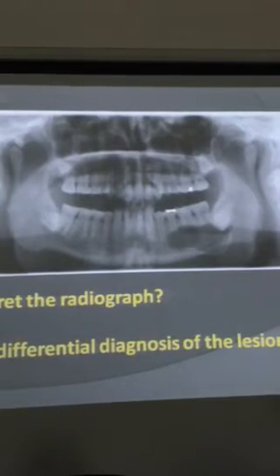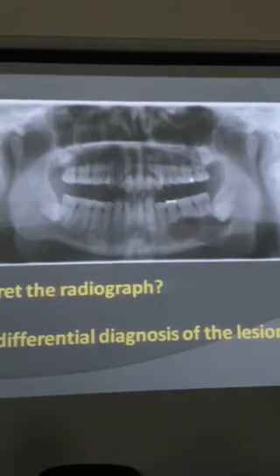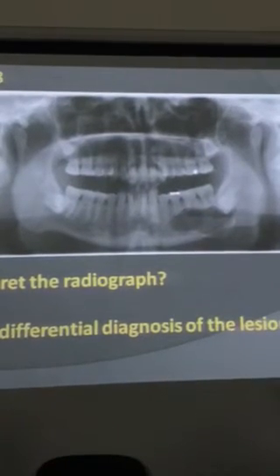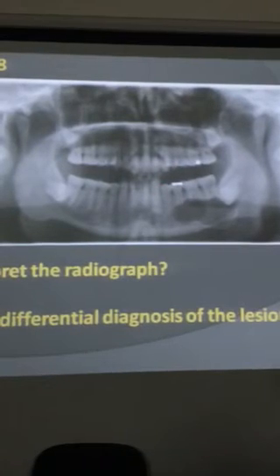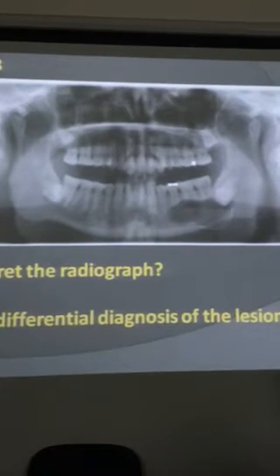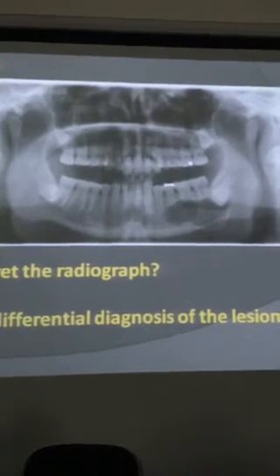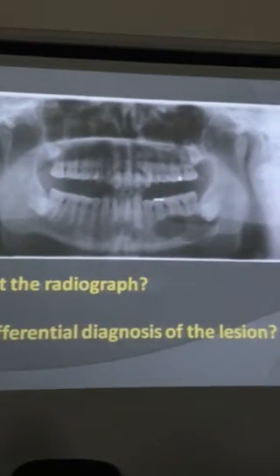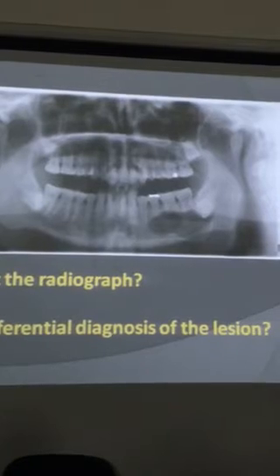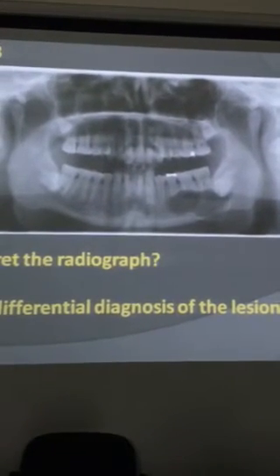Now you can come to the lesion. So now stop. Just try discussing. Periapical of 5, 6, 7. Anybody else has any other? Yes, pericoronal of 38. If you say pericoronal of 38, that is correct. If you say periapical of 5, 6, 7, this is also correct. Clear? Yes. So the first S is finished. Next S.